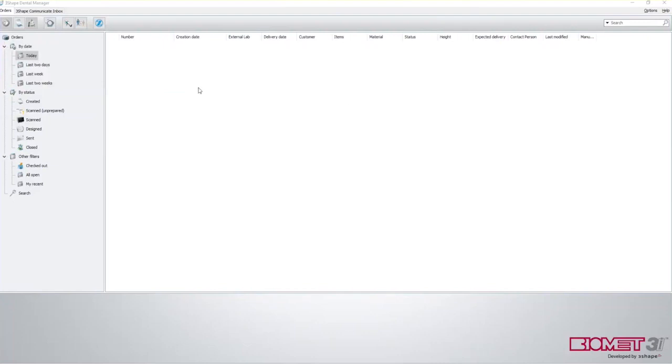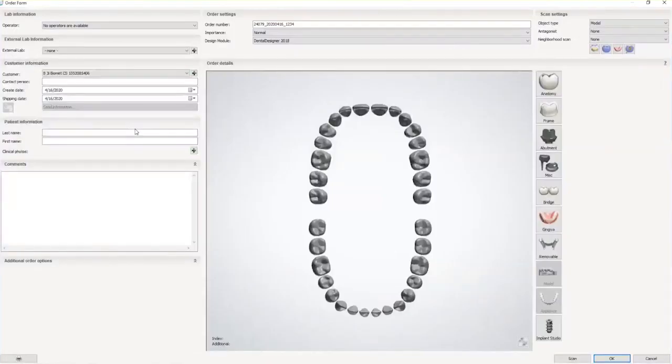So first thing we do, we will create a case. We've confirmed everything with the doctor and confirmed the ENCODE healing abutment decoding. We'll identify the case, be a TI base, ENCODE, number 9, tooth number 9.